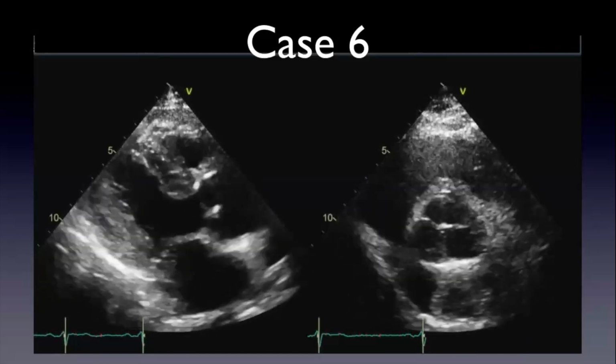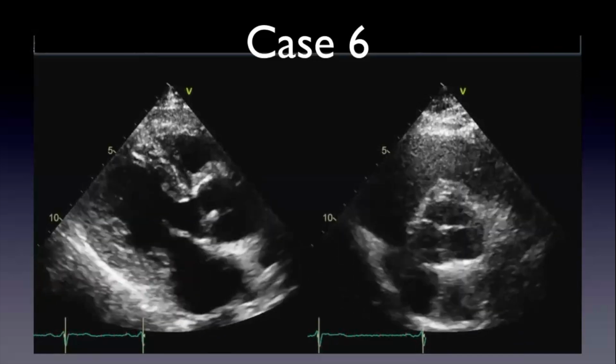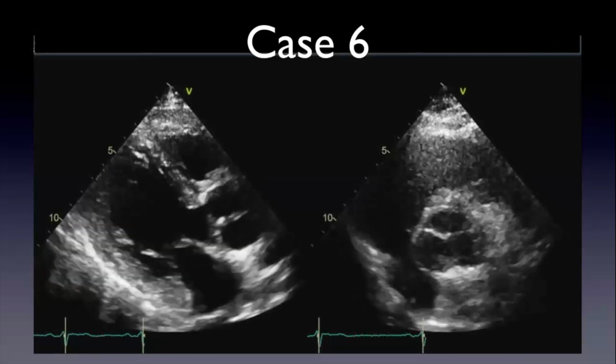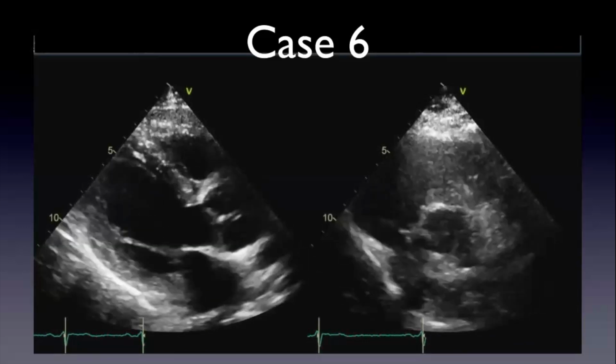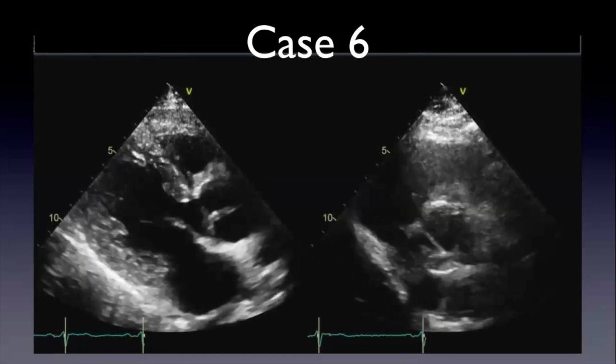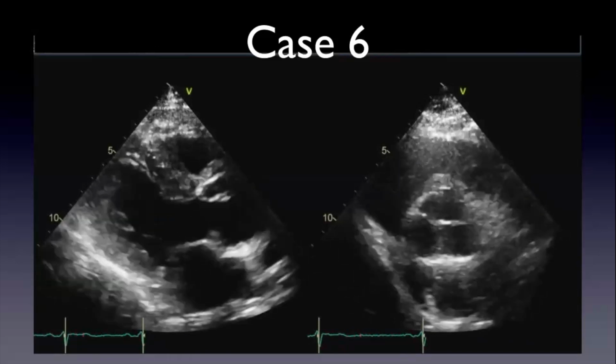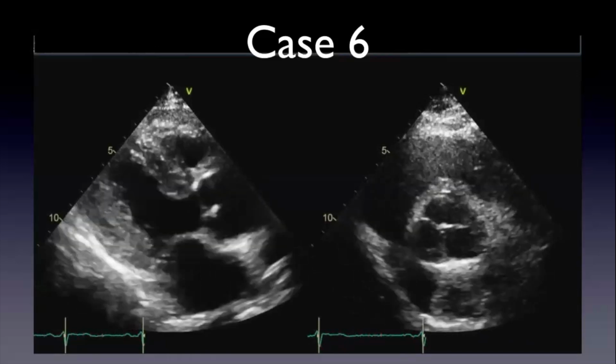Is that expected? I actually would not expect it, but I guess this is what happens. Dr. Peterson says that'll just go away, don't worry. They excluded it from blood flow, so eventually it just got absorbed. It's crazy, right? The body is like, no, it doesn't belong here. The human body is amazing.